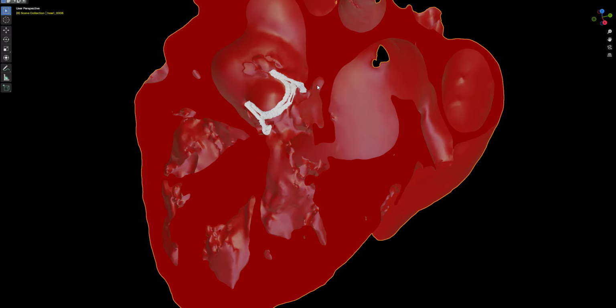On CT, there's a space between the LVOT and the left atrium with a jet through it. It is this space, a pseudoaneurysm, where we have that flap that's floating in space, and that jet comes through here. So that's the way I view this anatomy.